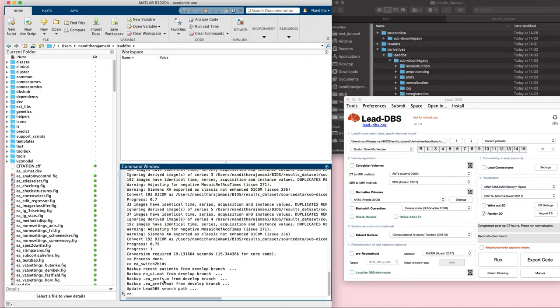Another important point to note is that if you are working with an ongoing project, it's always a good idea to make sure that you have a backup of these projects. The BIDS branch, while it is tested, is still in a beta version, and therefore it is always a good idea to have a safeguarded copy of your ongoing projects that are of importance.